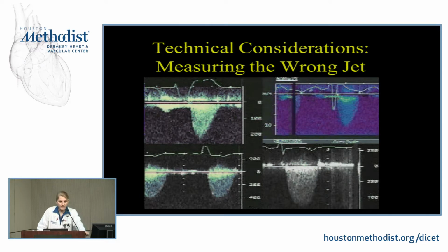So what you can do in this case, there's two tricks. You can look at what's happening in diastole, and you can also look at the systolic ejection period to try and figure out whether it's holosystolic or whether it's just occurring during the systolic ejection time. And sometimes you can literally just measure it with the guided and then take it to your blind, and that systolic ejection time should line up, and that'll help you determine exactly which jet is the correct jet. So in this particular case, the one on the left is actually a severe tricuspid regurgitation jet.